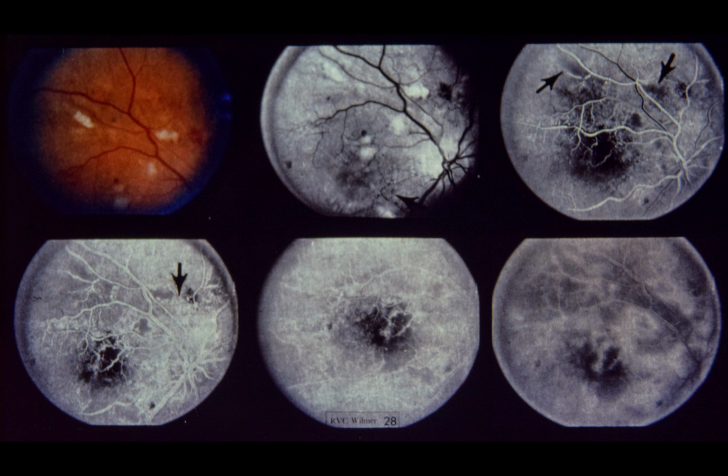Comment: at one time, cotton wool spots were considered the hallmark of hypertensive retinopathy. They also occur frequently in diabetic retinopathy in non-hypertensive patients. Several years ago, Kohner showed that ophthalmoscopic fading of the cotton wool spot is often associated with angiographic evidence of revascularization of the ischemic area of retina.